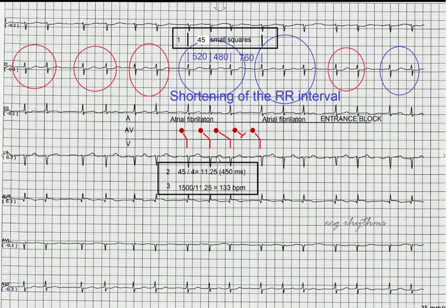Number 2 is to divide that RR interval by the expected supraventricular beats. In this case, we're thinking of the junction. So we're looking at a group of 3, so we expect that there will be 4. So we're thinking of 4 to 3.